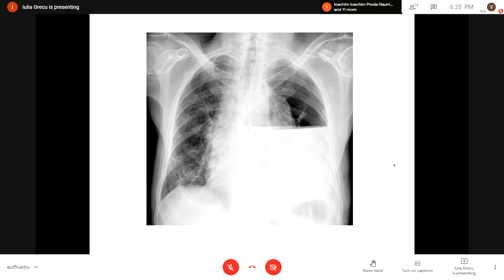I'm having trouble seeing the heart, so I'm trying to orient myself. Okay, it is the left side. Well, it's very opaque, and as in the last slides, I'm having trouble seeing the vasculature as well. So it looks like a mixture of pneumothorax and liquid.